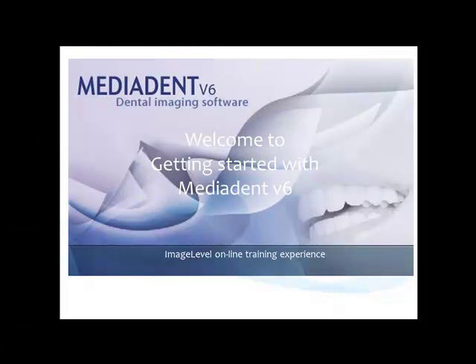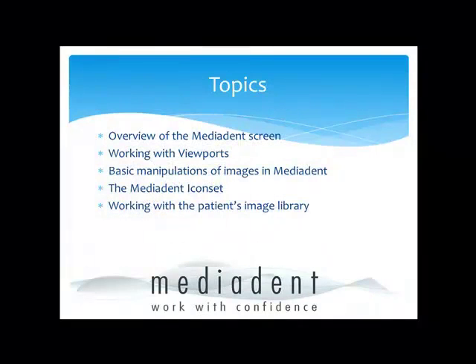Welcome to the Getting Started training session. This is the second training session you can follow. The first training session was the overview of the MediaDent screen. Now, in this short demonstration, we will focus on working with the viewports.